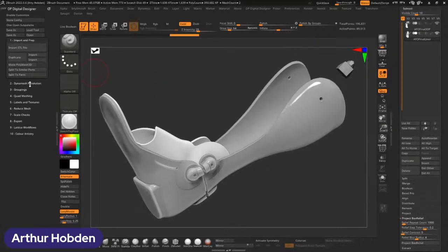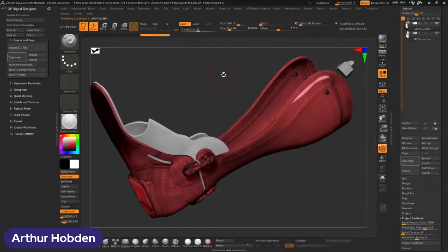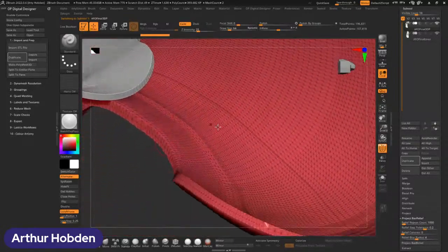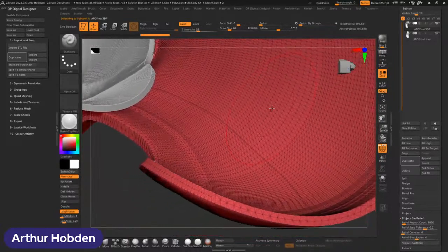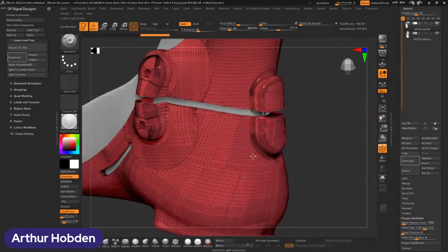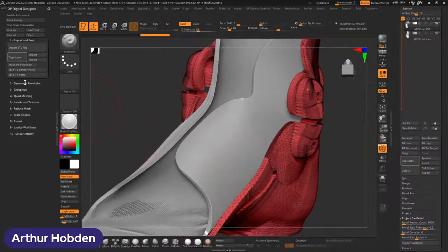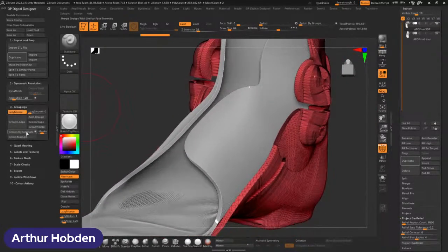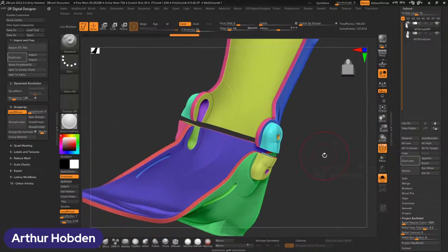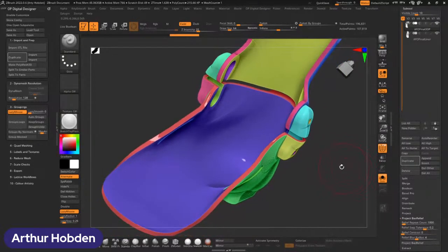So I'm going to start off by looking at the mesh of this shape. You can see this is a CAD export. CAD exports have a very different way of meshing themselves. It's very grid-like, and you can sort of tell where a mesh has come from, especially when it comes from CAD. It looks very different from a scan. So we can see that in the quality here. First thing I'm going to do is create groups, and groups from the normals of this shape. If I turn on solo right now, you can see that we can easily isolate different groups.